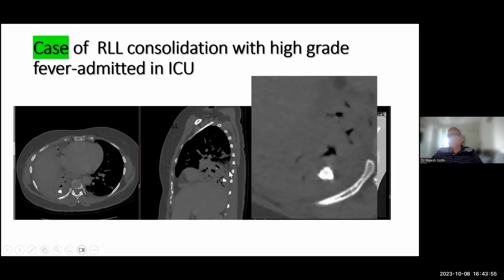So these things are also there. NCCT can tell you very easily what the finding is, and they are very rewarding actually when you look at these kind of cases.